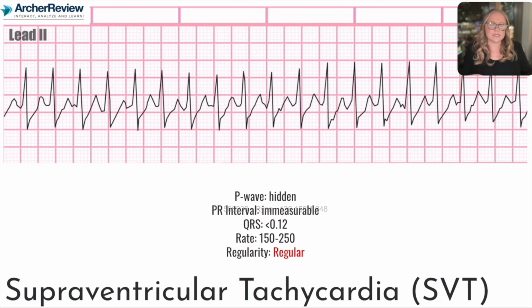We also see not only is that rate really fast, but it is super regular. Not just like, oh, it's regular, it's coming at normal intervals. It is so regular that it's not normal. You know, if I'm watching the EKG monitor for one of my clients, their heart rate, even normally regular, is going to have a smidge of fluctuation, right? It's going to be 60, 62, 64.